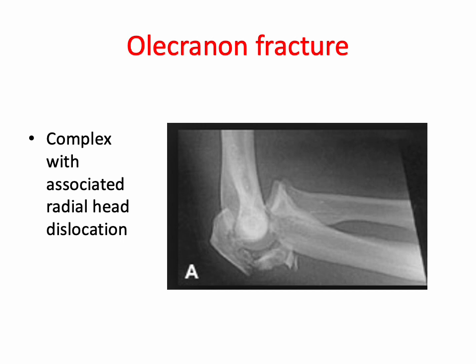Here's another comminuted, displaced, angulated fracture of the olecranon, with dislocation at the radial head. We draw a line down the radial neck. It's not intersecting at all where it should be with the capitellum.